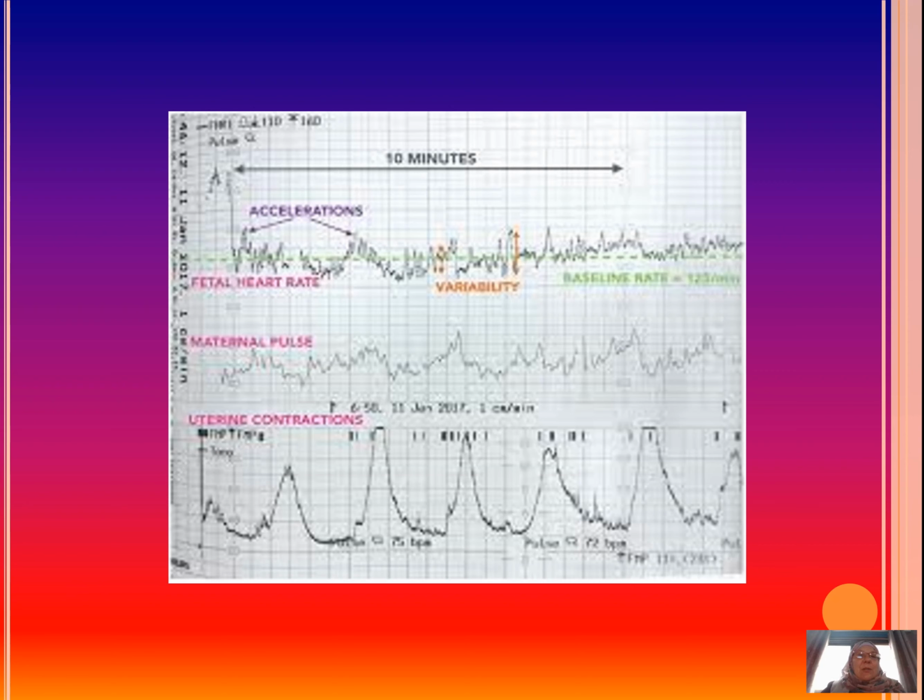as it is sometimes possible to mistake the maternal pulse for the fetal heart rate, and this is of course shocking because the fetal heart rate is above 110, but the maternal pulse should really not be above 80. So then you think, there's a deceleration, and you fear, but in fact what you listened to was the maternal pulse instead of the fetal pulse. So it can actually be helpful to have maternal pulse monitored to compare with.